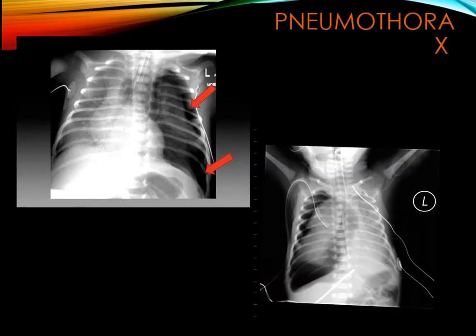Here are some other examples of the pneumothorax in pediatric age group. في الحالتين هذول الأطفال لديهم chest tube لديهم endotracheal tube بالإضافة طبعا إلى chest tube اللي هو treatment. They have endotracheal tube probably they are on mechanical ventilator. واحدة من مشاكل mechanical ventilator هو النيموثوركس.